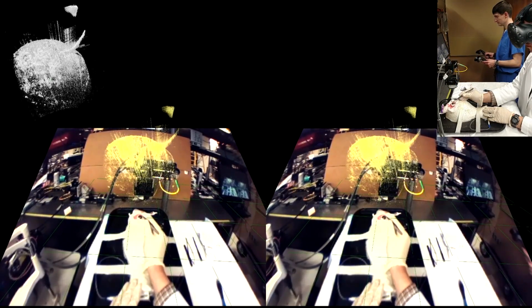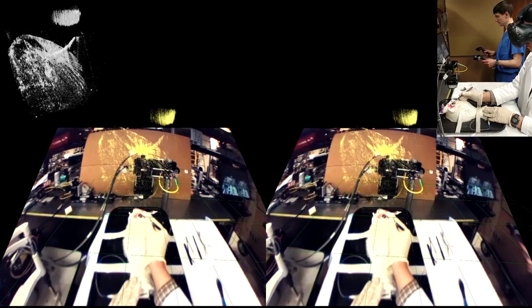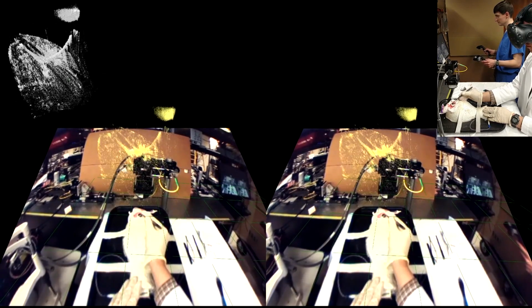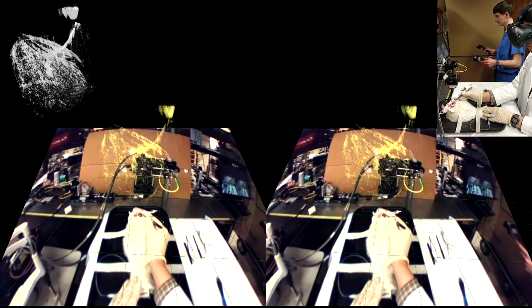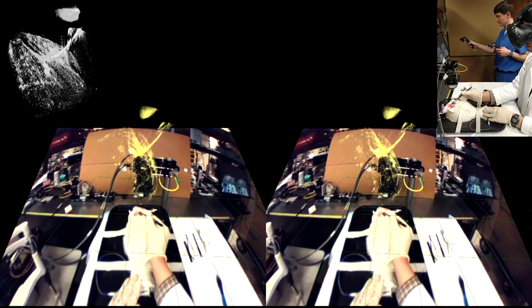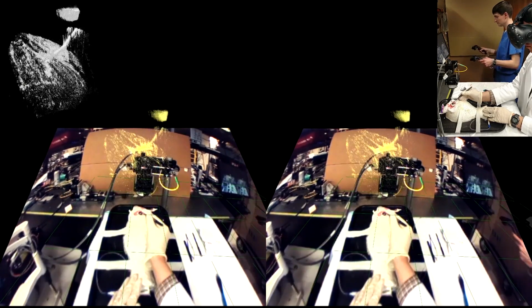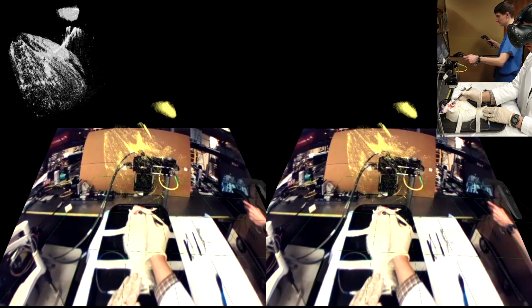We can even use OCT from within VR to guide mock surgical procedures. For this application, we provide external video feed-through to keep the immersed surgeon oriented. Because the surgeon's hands were occupied with surgical tools, we provided an external operator to manipulate the OCT volume on behalf of the surgeon.